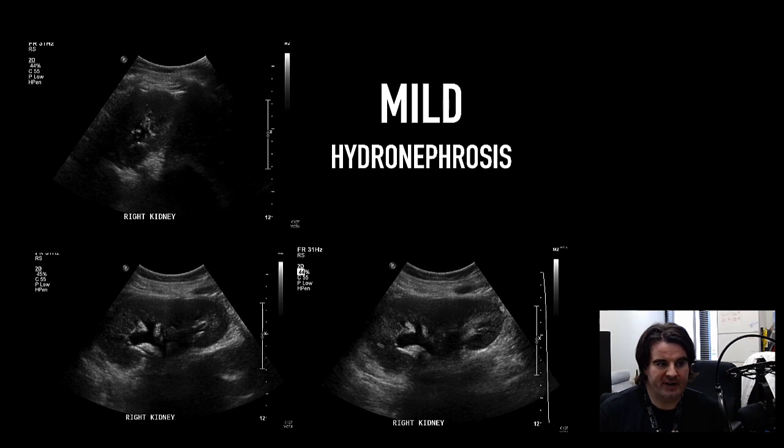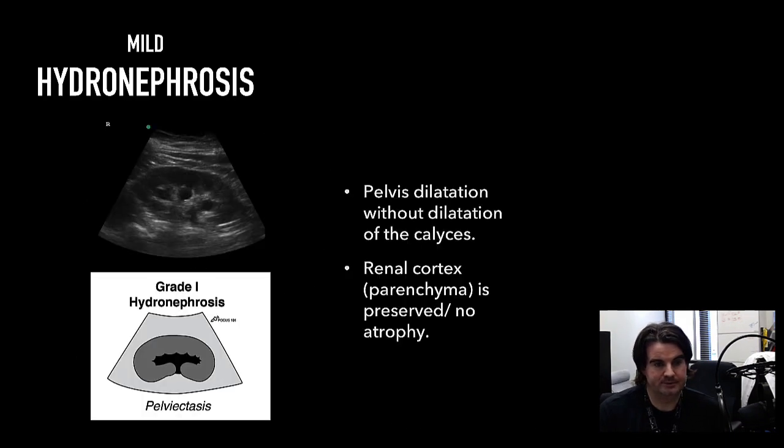Here we see various images of mild hydronephrosis. We can see enlargement or dilatation of the anechoic renal pelvis, and it's much more noticeable than you would see normally. So we see dilatation of the pelvis without dilatation of the calyces. That's an important feature of mild hydronephrosis. And really the renal cortex or the parenchyma should be fairly preserved with no evidence of atrophy.